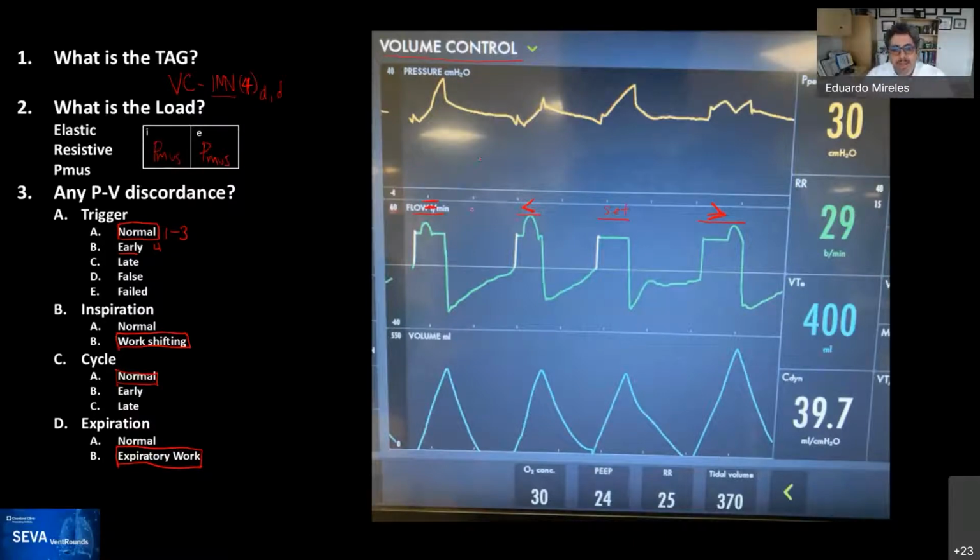The rationale for that is that when you have a set inspiratory time like here, and a given flow, you're going to deliver the tidal volume that the machine wanted, and everybody's going to be happy and applauding. Yay! In this one over here, it's probably a little bit shorter, but because there is this changing flow, because the patient got a little bit more breath, you can notice back here that this is the tidal volume that has been set.